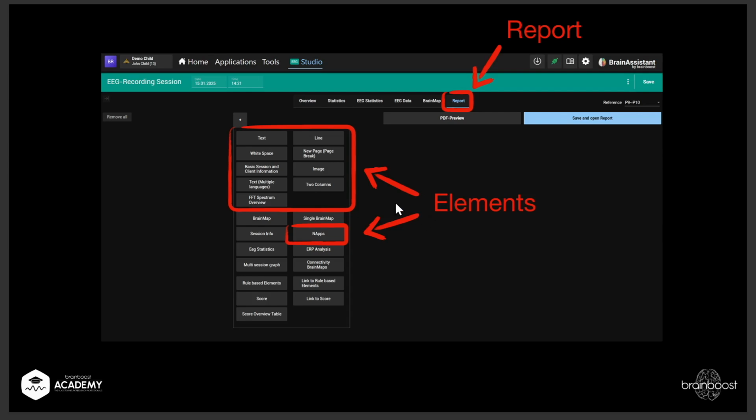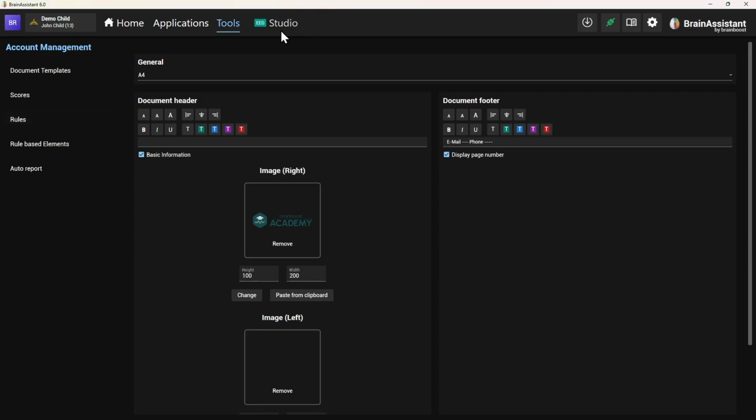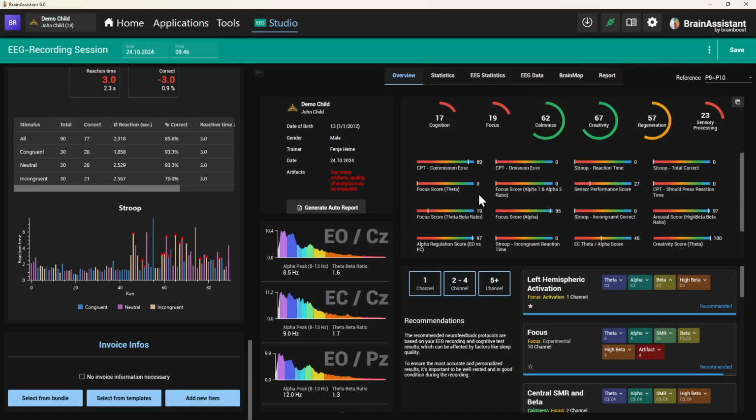We can see this in the EEG, yes, but the EEG is maybe a little bit complicated for you at this point, which is fine. So I'm going to show you just a test. How do you do that, for example? This is where you might want to start, and this is just a little hint: you might want to start completely blank. So we performed everything here.